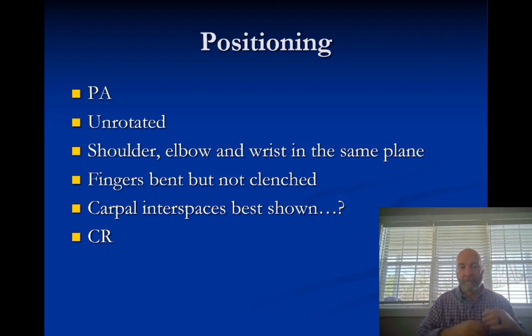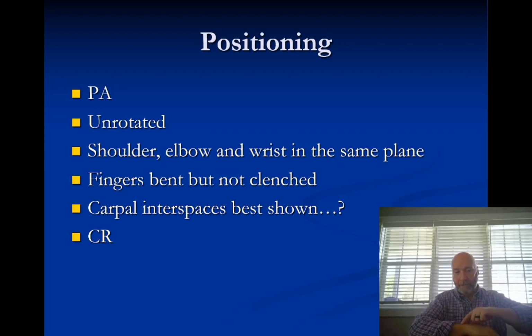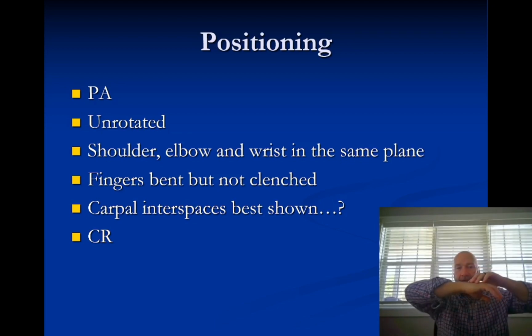So the evaluation criterion Merrill's calls for is that ulnar styloid process to be projected medially. All right, so it may actually say laterally, and in context, neither one is wrong. It's pointing that way is what we want to see. So right now it's pointing that way, which is not what we want to see. So if you put your finger on that and then you elevate your shoulder, your elbow, and your wrist to all be in the same plane, what you'll find is that it disappears. It's no longer sticking up. Maybe you can visualize the bump right there, but when I get up to here, it kind of goes away. So it externally rotates, or I guess that would be internally rotate. It rotates out and away.